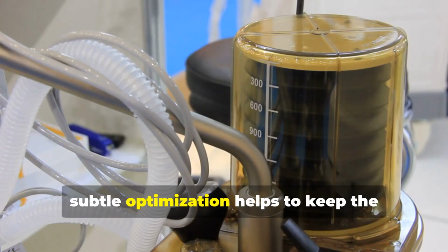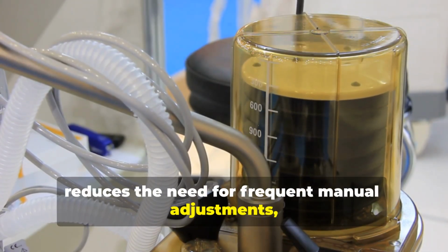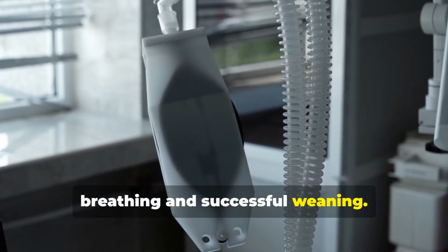This constant, subtle optimization helps to keep the patient in a lung-protective state, reduces the need for frequent manual adjustments, and can facilitate a smoother, faster transition towards spontaneous breathing and successful weaning.